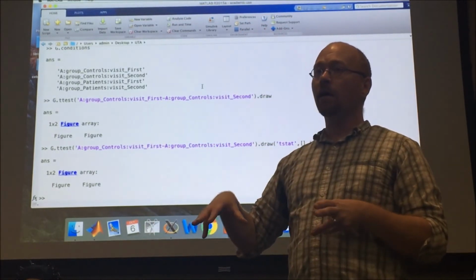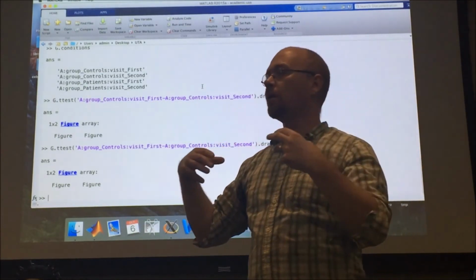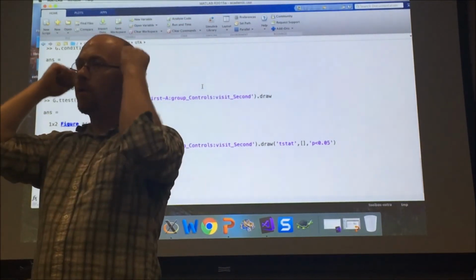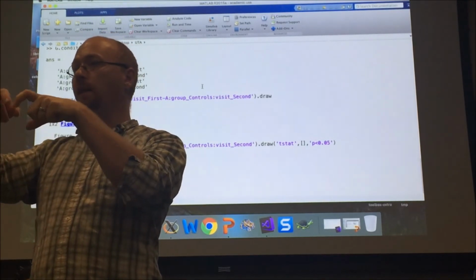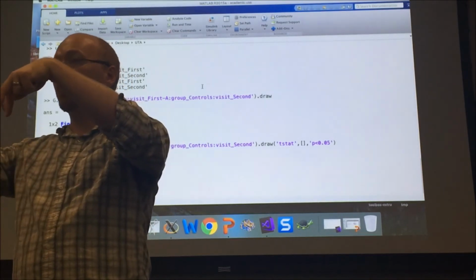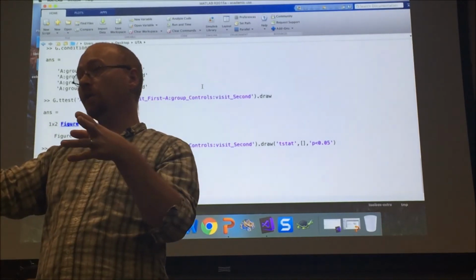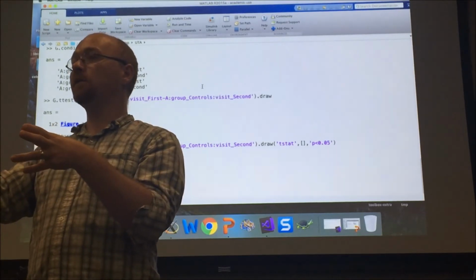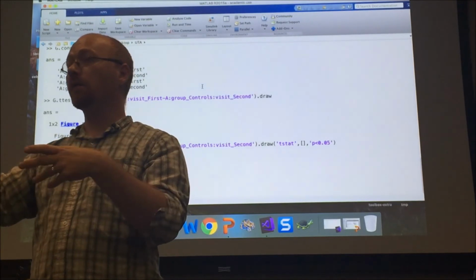What we did here was we loaded up the data. We assumed that the probe, because it's aligned to the 10-20 system, was put on the cap in a reproducible way. So we're assuming that channel number 1 was over the same anatomy in every subject for what I did here. If you have variability in head size, we're working on ways to account for that.